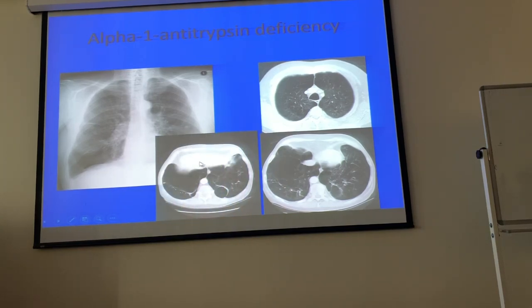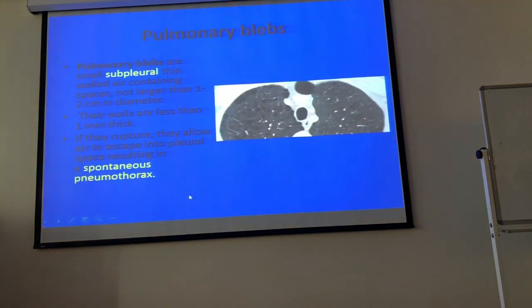See here, now if you have turned into soft tissue windows or mediastinal windows, this is liver actually. So this is the extreme lower portion of the lungs, and you have so much destruction with a bullous formation.